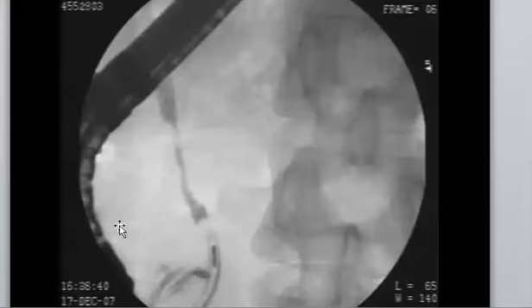Okay, so again, ERCP, and you find the stricture. Is it a benign looking stricture or a malignant looking stricture? Malignant. Why malignant? Because it is irregular, and there's a stricture which is irregular. So the most common cause for this is cholangiocarcinoma, one of the most important things to consider in the biliary system.